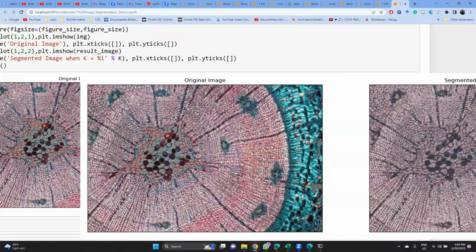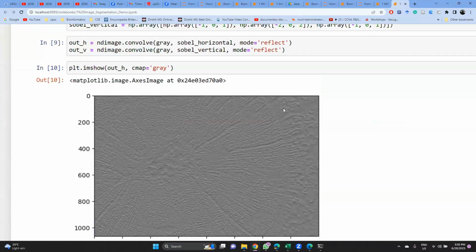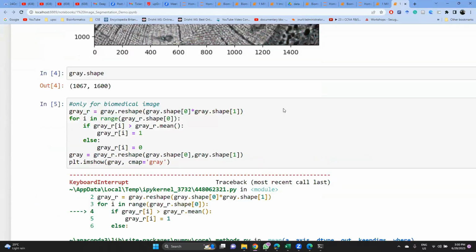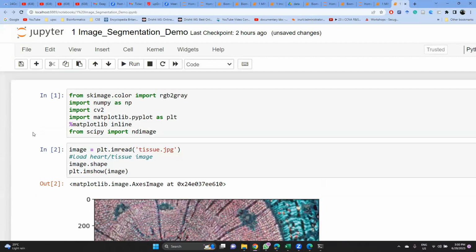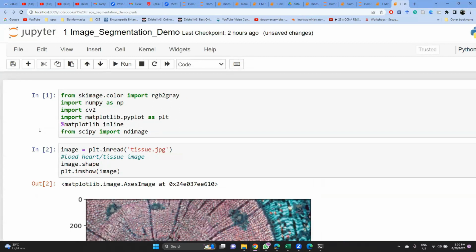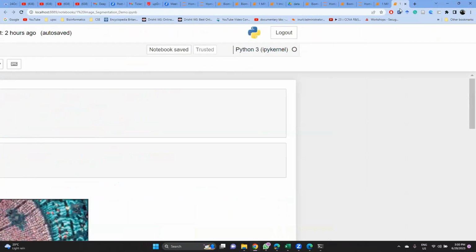In this way, we can perform the analysis with these small codes. If we use a Python GUI based interface, then we can make a tool out of it. It will depend on the research, in which domain we are working. For a particular image, we can make a similar tool.